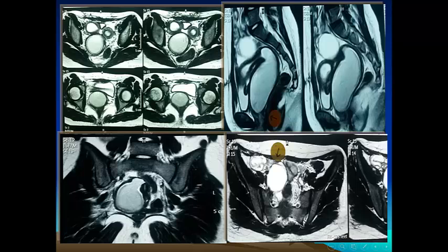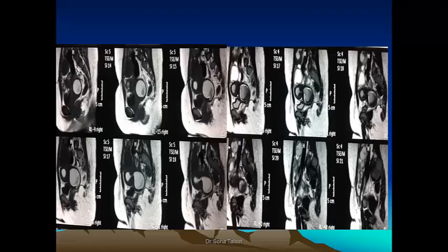Complications of obstructed anomaly. Another case, here this is hematometrocolpus also. It is bright in T1 with shading effect on T2, as we stated before in the endometriosis. This is the blood signal. Bright, this is the normal blood signal. It stays bright on T1 with shading effect in T2. Obstruction where? In the upper vagina.